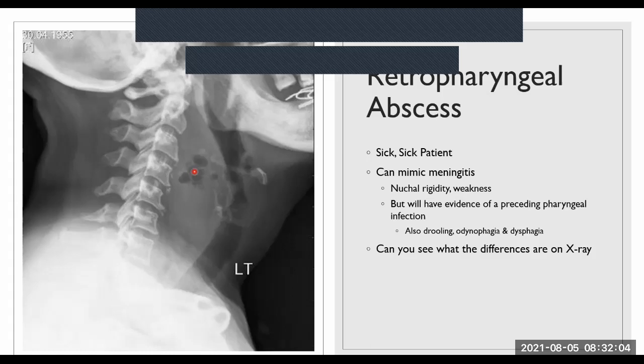What's the other thing that we notice on this X-ray? Because we all love to look at the big flashing red light and we forget about other things. So still look at your C-spine. What do you notice about the C-spine? Absolutely straight. The reason for that may be muscular spasm, or simple swelling in itself. It doesn't mean this patient has also developed a fracture over here. Don't stress. But what I'm saying is, look at everything. Don't just say, yay, I found the problem, so I'm going to stop there. You must look at everything because you may find other things.